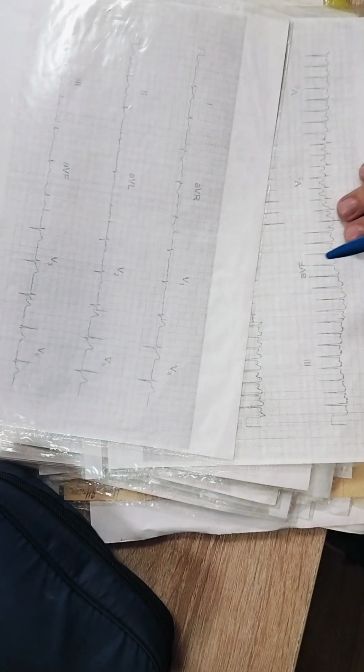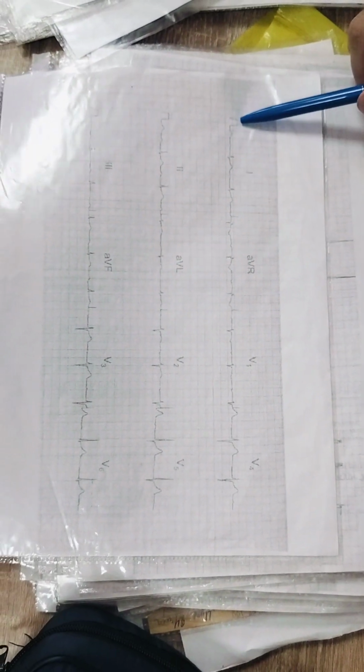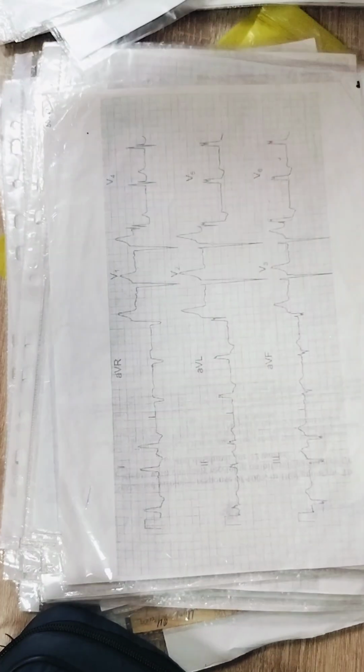First step of ECG assessment is, what is first stage? Quality. Is quality okay? No. 5 millimeters. So can we continue assessment of the curve? No. Rejected.